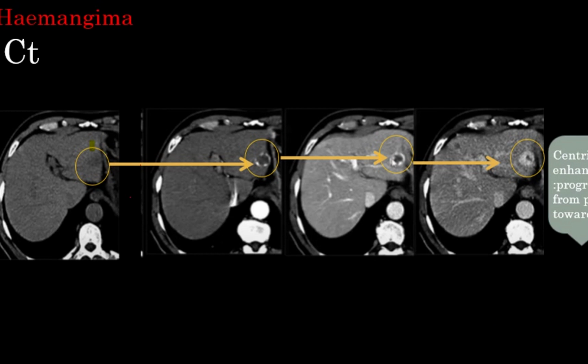There are two types. As I read, if it's the cavernous type, the caliber is larger, so there's blood flow. Sometimes they take vascularity, but most of them don't. The surprising thing on Doppler is that the capillary one, the more common one, shows no flow. But try to do a biopsy for it, it will bleed like hell.